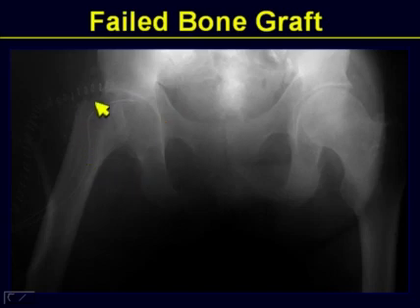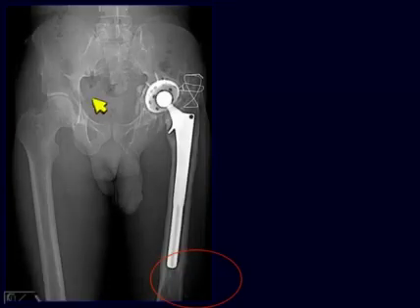Again, the patient needed a post-operative, as you could see, changes here in this individual, and of course he went on to have a hip replacement later on. Once in a while we encounter cases like this wherein we're sure that the pain is secondary to this prosthesis. We warned you, while it's very easy to approach the hip portion, the intra-articular portion, it is not uncommon that something else is going to occur extra-articular or distally.